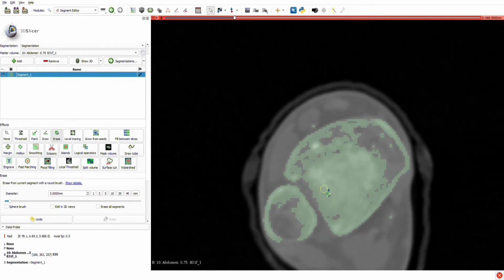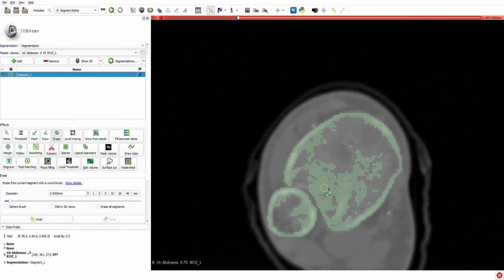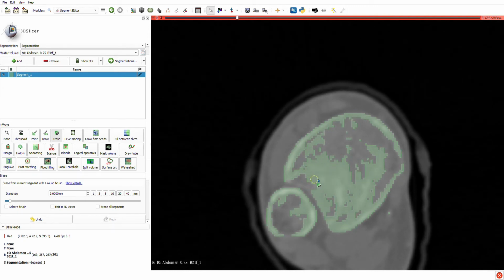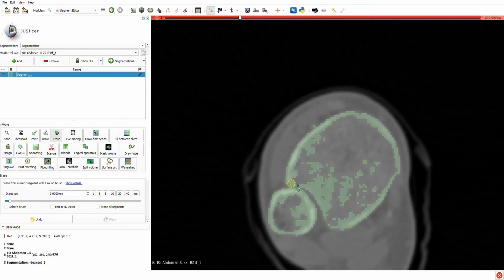The best is to have as thin a slice as possible, but if you have slower computers, it could be time consuming and cumbersome. Slices of 1 millimeter or 0.75 are okay. Don't go above 1.25.